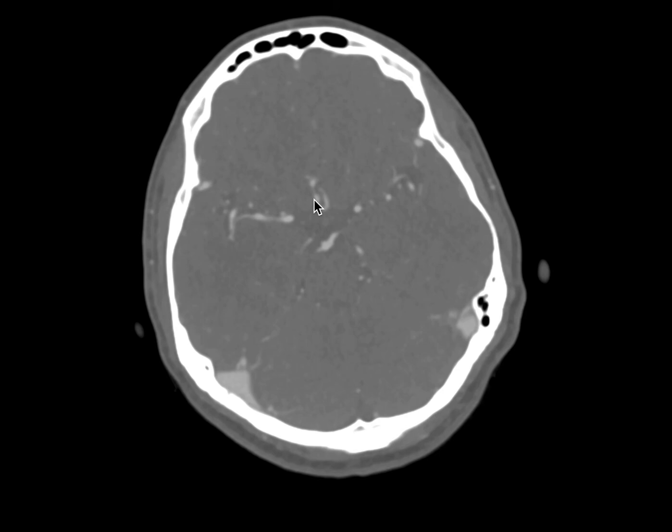This is seen in about 2 to 7% of cases and results in both cerebral hemispheres relying on the dominant A2 segment. Also in azygos anterior cerebral artery, there is a similar dependence on the single vessel ascending for both cerebral hemispheres. This means if it gets occluded, there'll be ischemia and possible infarct bilaterally.